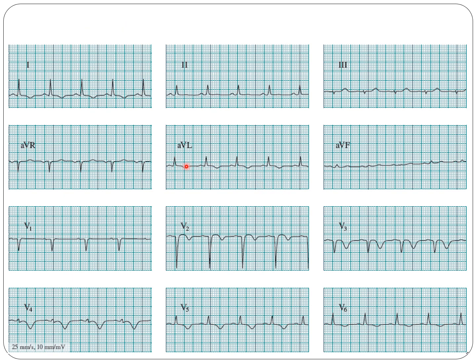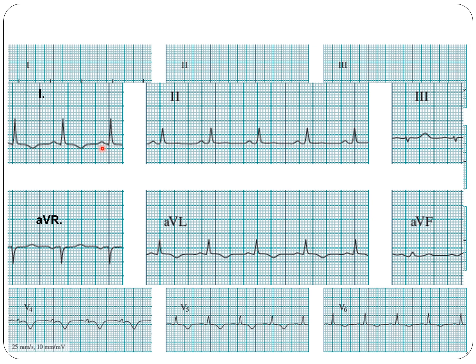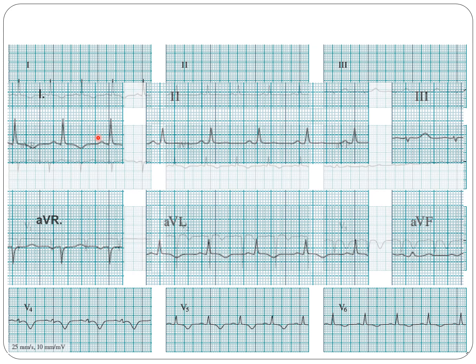The next one, again, is rhythmic. Heart rate is 90. We do have sinus P wave, positive in 2 and negative in AVR. Morphology and the PR is normal, QRS is not wide. Axis: lead 1 positive, AVF is positive, it's almost 0, so the axis is 0.